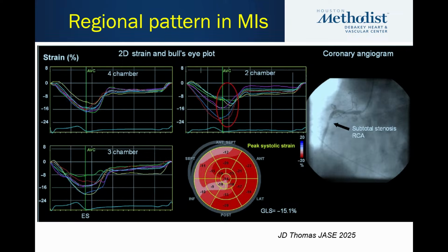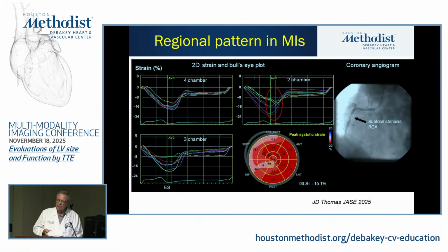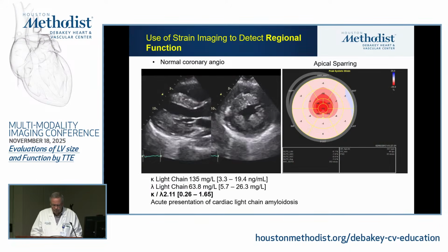So again, you don't care about the absolute value, but the pattern apparently has been observed as being fairly reproducible in the region of ischemia, where you may have this very early post-systolic further shortening, and lo and behold, we have been talking about this for decades, something called post-systolic accentuation in patients in an ischemic myocardium that is still not totally dead. So this is more of an acute finding in the early hours of an infarct. Kind of acute, interesting observation.